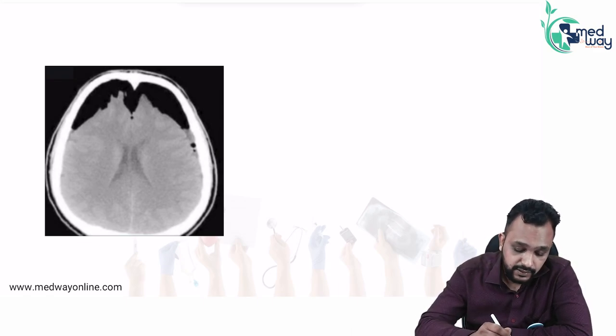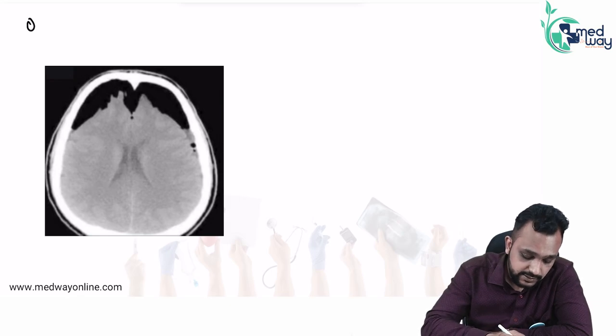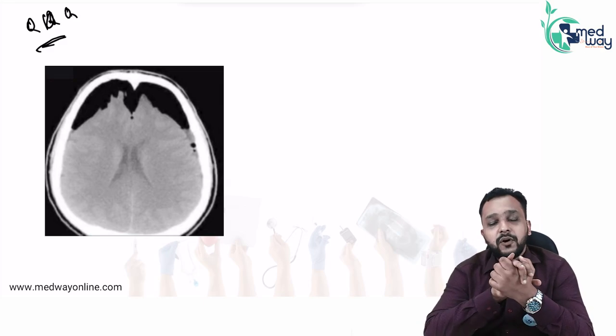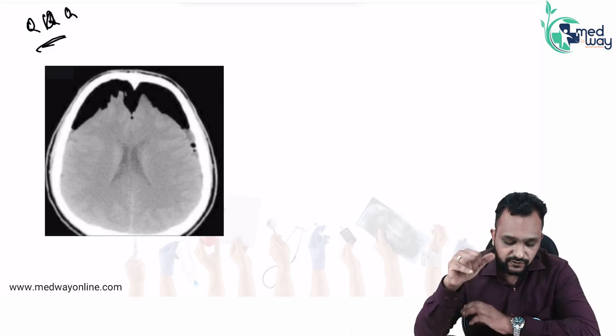Another very famous sign that is again asked in many exams. So what are the two things which appear black on CT? One is air and the other is your fat.